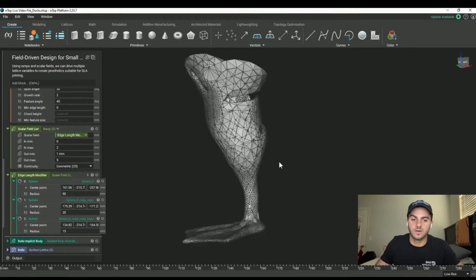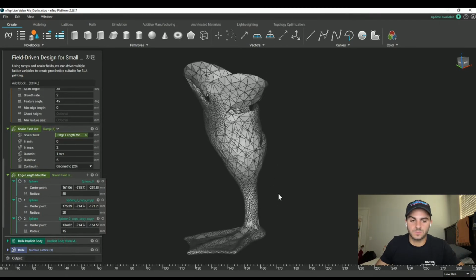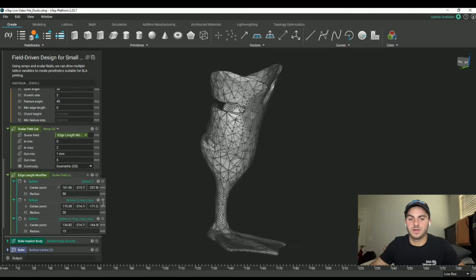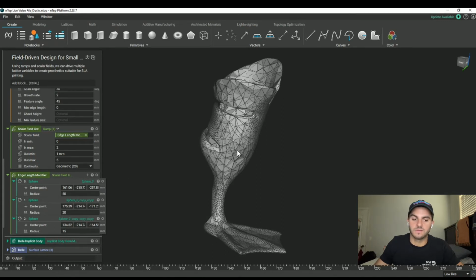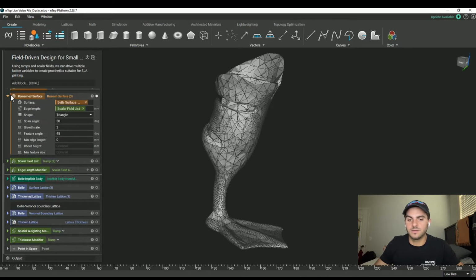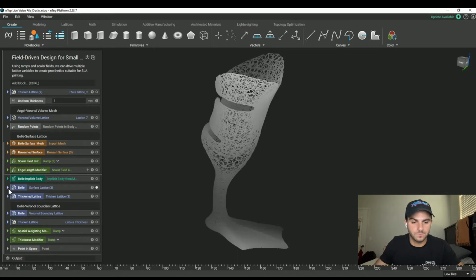And so let's say the patient comes in and tells us, hey, the Belle looks like it's not very comfortable, and it's too rigid right now. We want a more compliant response, right? So we would probably add or take away certain scalar fields to relax the overall volume or surface mesh.